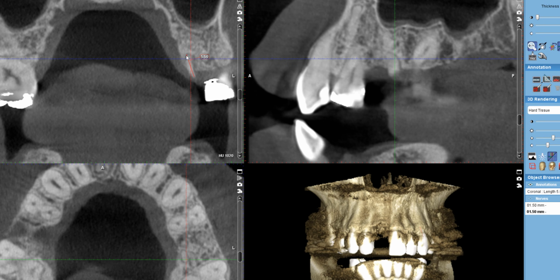It has failed to be removed entirely, and it's still positioned under, or in this case I could say above or under the soft tissue. So yes, that's a problem, right? If you're placing implant in this area, you probably want to take that out.